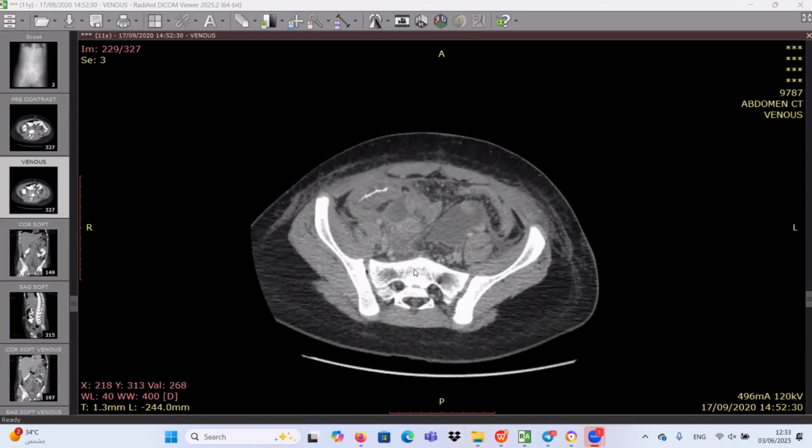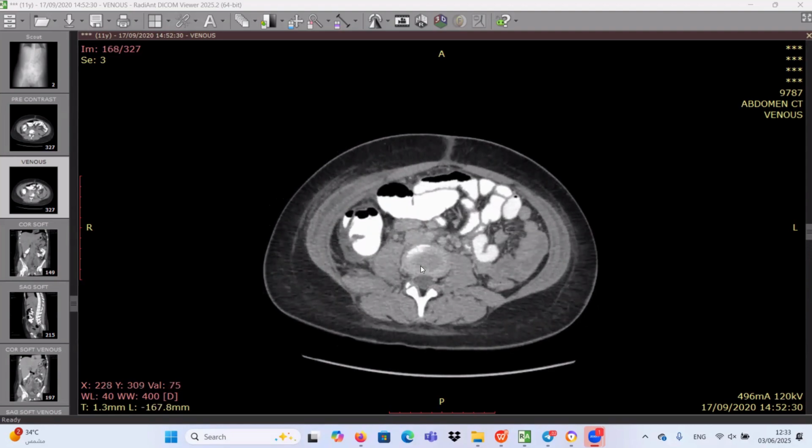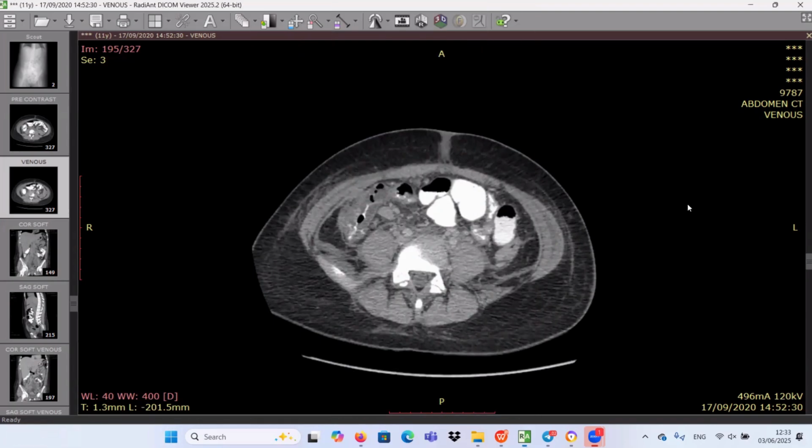We also have lymph node enlargement, some mesenteric lymph node enlargement. There are actually lymph nodes in this region, as you see here. So we have mesenteric lymphadenopathy. What do you think this complication is? Sir, this is a post-op infective complication, colitis. Yeah, I agree. And complex ascites.